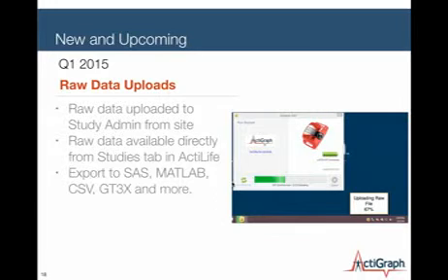And coming late Q1 2015, we'll close the loop and allow two-way communication, allowing you to receive notifications from subjects, just noting that, hey, they did receive your confirmation and that they are indeed compliant with that. And so lots of requests for that option to be able to communicate in two ways with the subject while they're collecting that data.